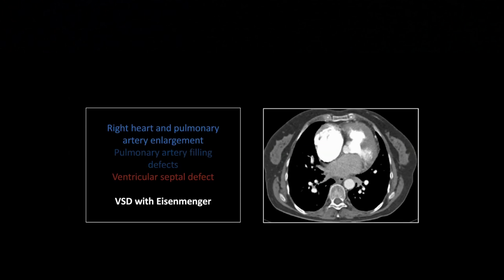And here, you just marvel sometimes at the timing that was required. You got to find an old patient who's had a VSD all her life and then nail it with the contrast on the right side of the heart. It's pretty incredible that this all came together.